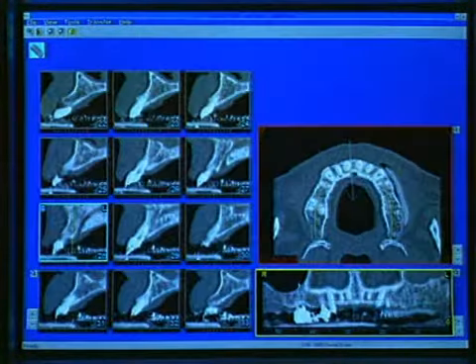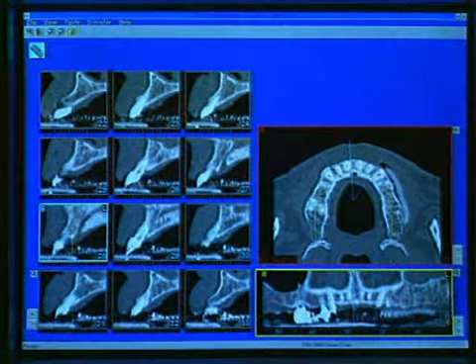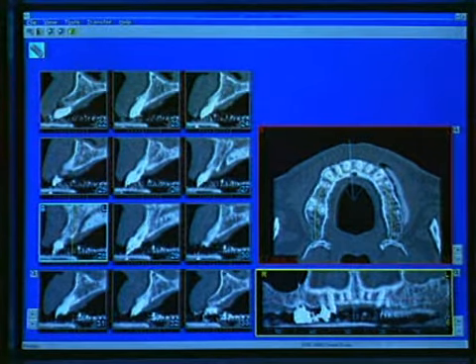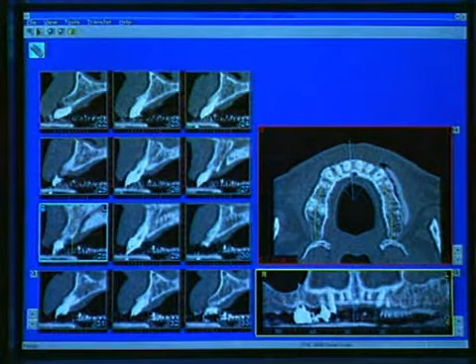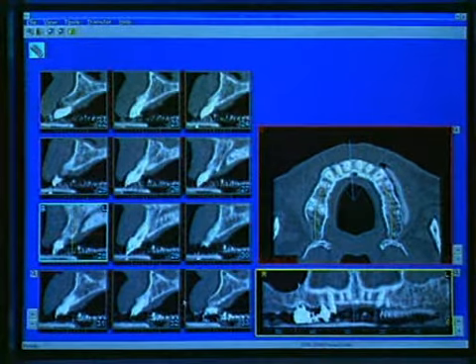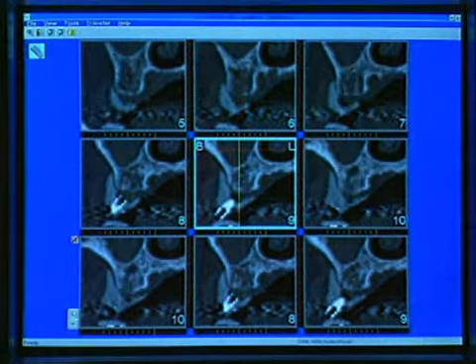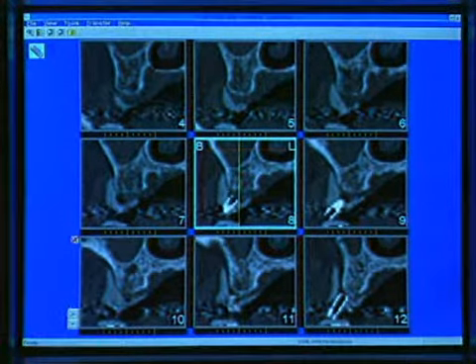The software represents the available bone substance in 3 different projections for further analysis. The right-hand side on the top shows the axial projection of the maxilla. On the bottom right side you can see the panoramic projection, and on the bottom left side you can see the various cross-sectionals of the maxilla. Now we will pick out these cross-sectionals that include the titanium cylinders and thus the planned implant sites.